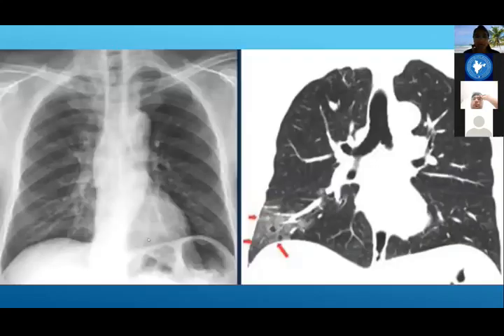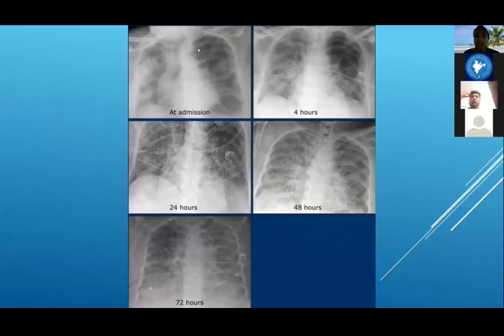This is what I have told: this chest X-ray of a COVID positive patient was taken on the second day. It is clear, we are not seeing any lung abnormalities, but the corresponding CT shows some ground glassing in the right lower lobe, which is usually the early finding in COVID-19, which is missed in the chest X-ray. But that is not a problem. We can take serial X-rays for looking at the worsening of the condition. So this is the main role, that is the regular monitoring.